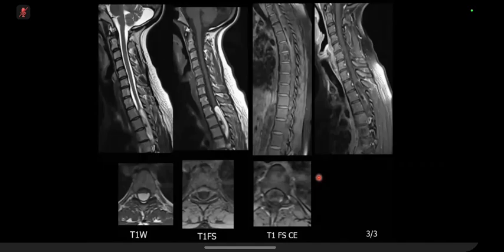There is surrounding hyperintensity on T1 and T2, which is saturated out on the fat saturated images. There is some post-contrast enhancement of the soft tissue density seen within the middle, and there is a fat-fluid level looking thing on the T1.